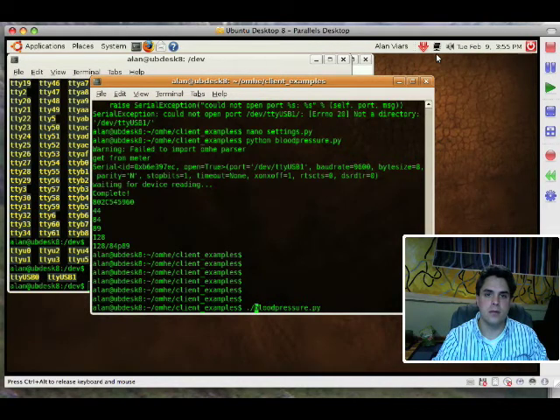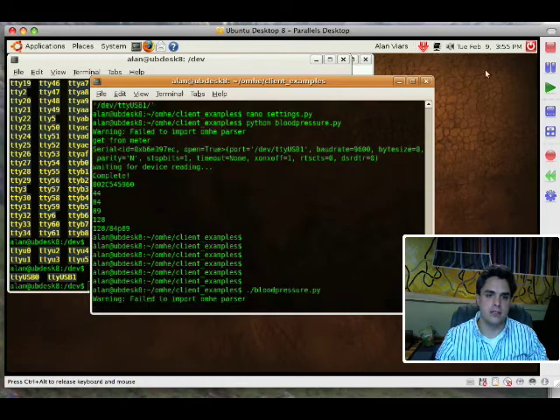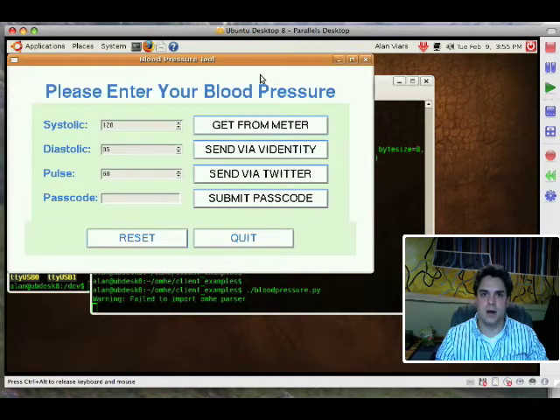So the first thing I'm going to do is show you a sample application. This is from our repository, our development branch. So it is accessible, but it's not ready for prime time. But we'll go ahead and give you a preview.